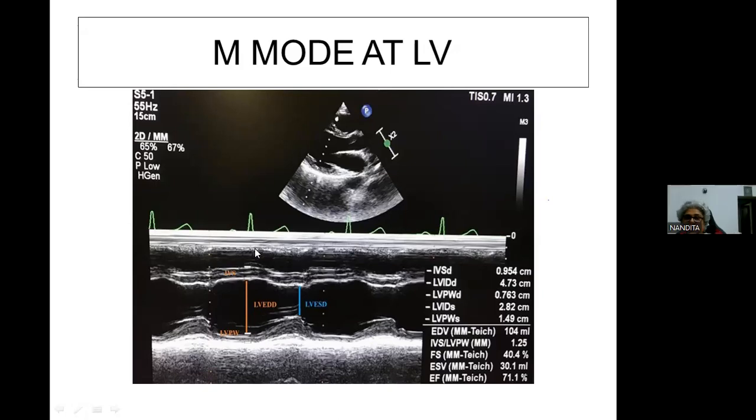Let us wait. We'll leave it to sir in his practical demonstration. You will be absolutely clear then, when he shows you slowly how he's dropping the cursor and where he's dropping the cursor. Because these are frozen images, they might cause you some confusion. We'll come back again, Rohtas.